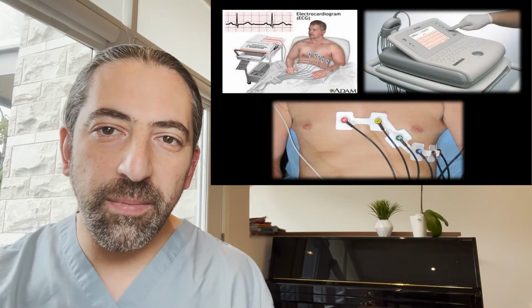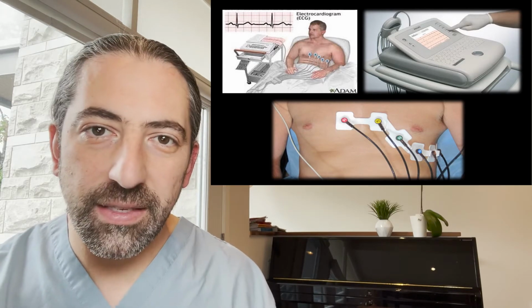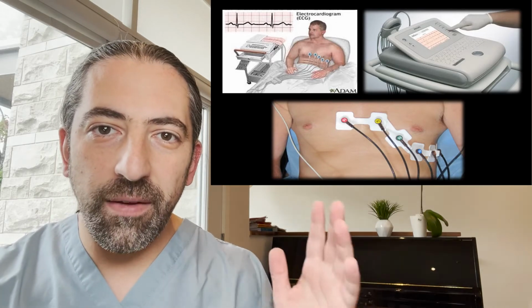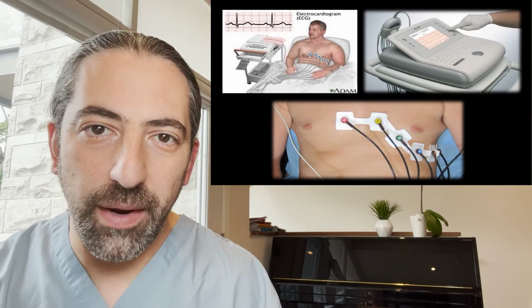Since then, the ECG has become a very simple tool that can be obtained from a patient within a few minutes. Electrodes are placed on the chest and on the limbs, and within a few minutes you have a 12-lead ECG tracing that can be used to diagnose multiple abnormalities of the heart.